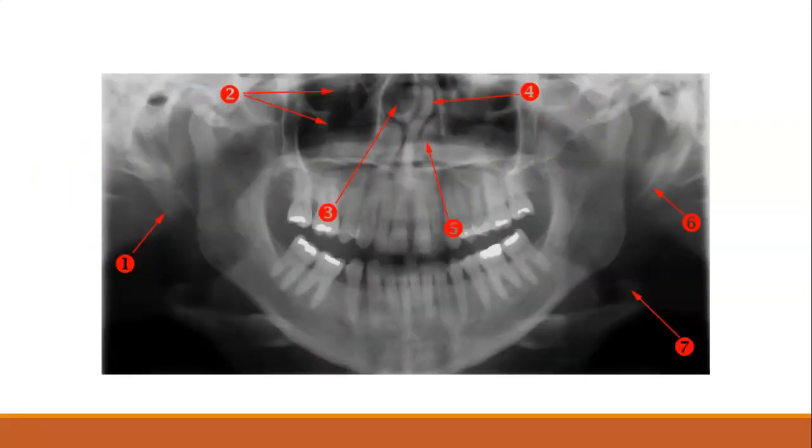Okay, different Pano here. We can see the ear pretty well. Here's the inside, the ear canal would be in here, but you can see all the soft tissue of the ear right through there. And then number 6, I'm jumping ahead, is the styloid process right through there. But number 1, here we have the earlobe on the other side.